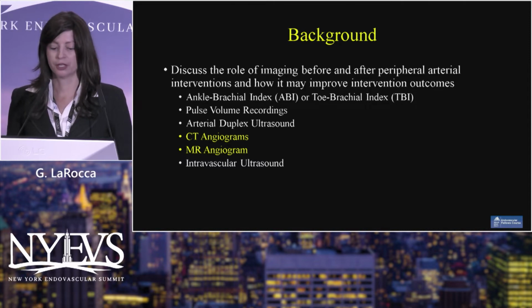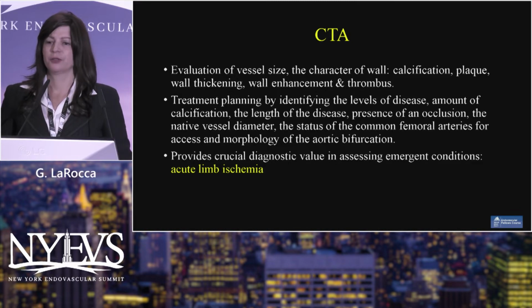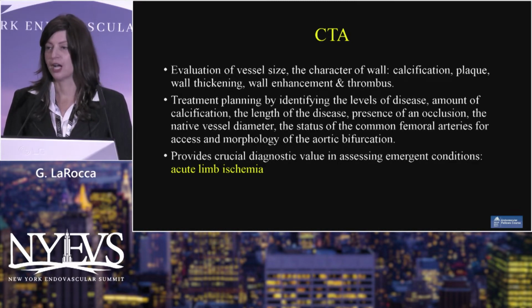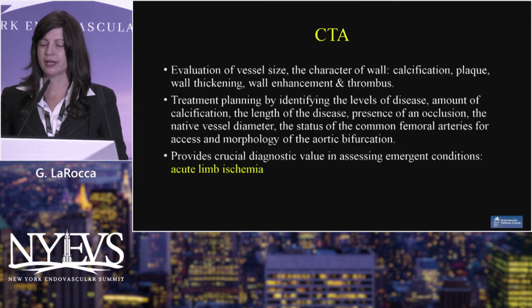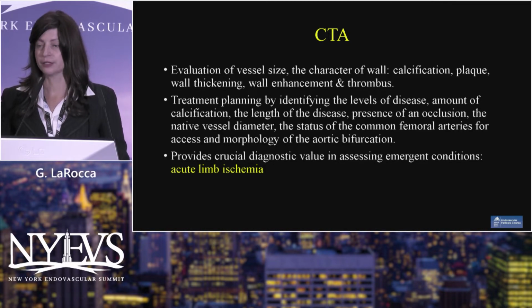I will not be touching on intravascular ultrasound. So why is CT so great? Well, it really has a great evaluation of the vessel size, the character of the vessel wall, particularly the aorta and its great vessels. It looks really well at the calcification and calcified plaque, as well as non-calcified plaque, wall thickening, especially wall enhancement if there's aortitis. We make quite a few of those diagnoses, and any type of mural thrombus.